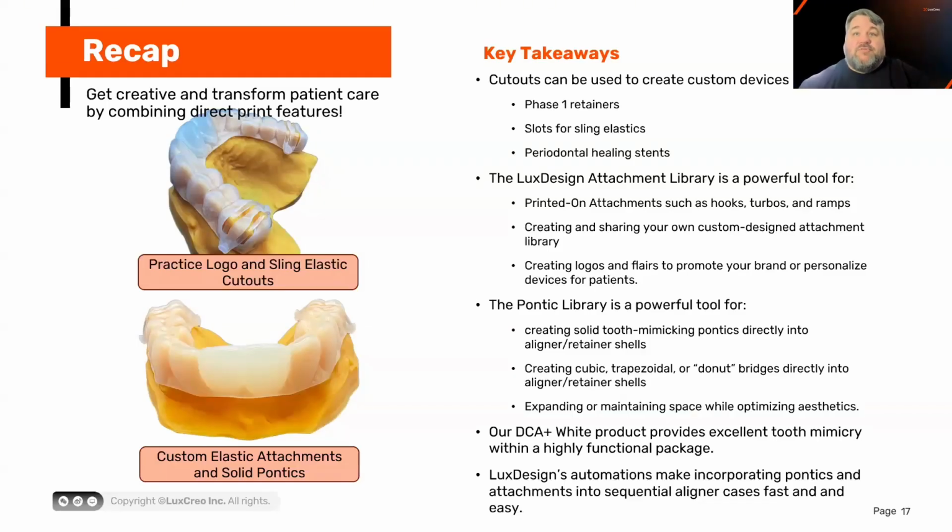I hope and I trust that your gears are turning with all the possibilities, and with the tools that we provide in LuxDesign, things like using cutouts for those phase one retainers, sling elastics, periodontal healing stents, using custom attachments for hooks, turbos, ramps, being able to share your innovations amongst your peers, or to add that personalization and branding for you or your patients.